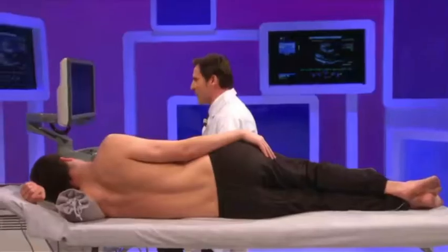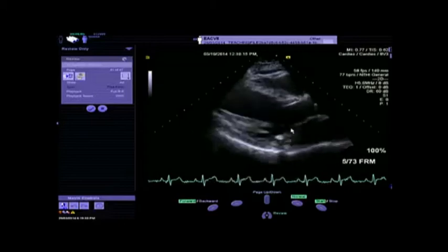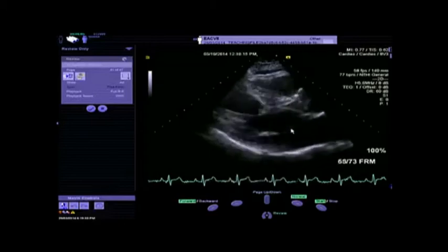But be careful. For the diagnosis of mitral valve prolapse, you should use the parasternal long axis view, related to the saddle shape of the mitral annulus. Don't try to use the apical four-chamber view to make the diagnosis, because you will have some false positives in this situation. So for sure, during the examination of the mitral valve morphology, you should also be able to determine the likelihood of mitral valve repair.